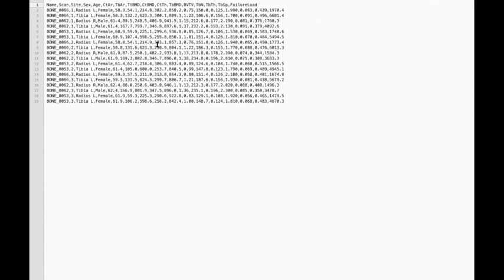And this is the file that needs to be loaded onto Normative, okay? So it's just the same information, just commas separating the values. And you can see the finite element failure load is the last set of values, etc.